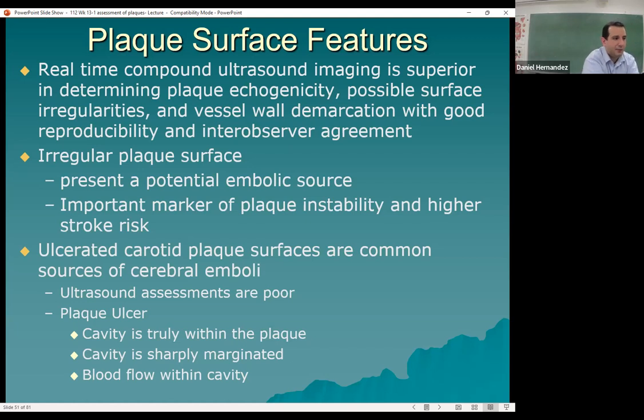So it's really not that difficult. You might also use calcified. That's another term that they like to use at Christiana describing the plaque. Is the plaque calcified? So is it homogeneous, heterogeneous? Is it calcified? In terms of echogenicity, you can say it's hypoechoic, hyperechoic, echogenic. So use your descriptive terms.